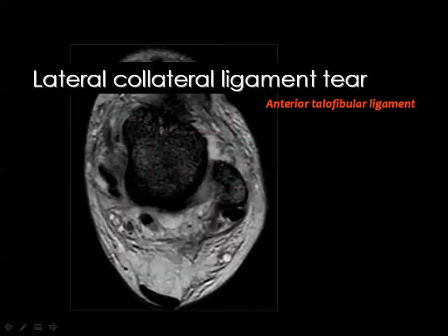And this is the level of the fibular groove. This is the posterior talofibular ligament. The anterior talofibular ligament is not present, and its site is occupied by fluid, meaning that it is ruptured.